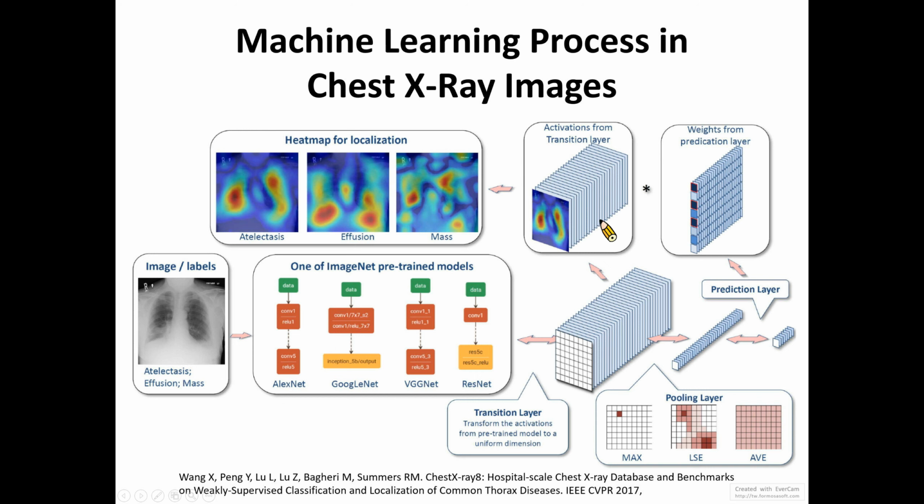In the final layer, you can see the classification output, but the most important layer is the probability layer. It's called softmax. It outputs the probability of each classification. Here, the pre-trained AlexNet model has 1,000 classes. This is the standard trained model from ImageNet, but we are going to use it for transfer learning.